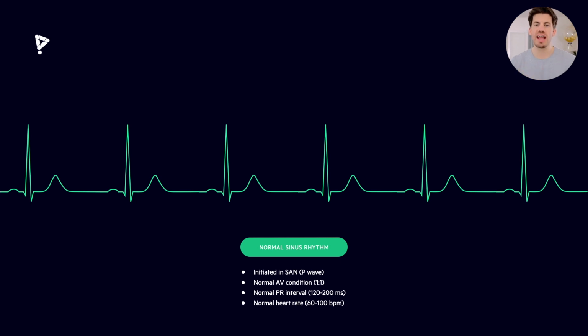There's normal atrioventricular conduction, so there's a 1-to-1 ratio: every P wave is followed by a QRS complex. We have a normal PR interval, and we have a normal heart rate, 60 to 100 beats per minute. So these are the defining features of normal sinus rhythm.